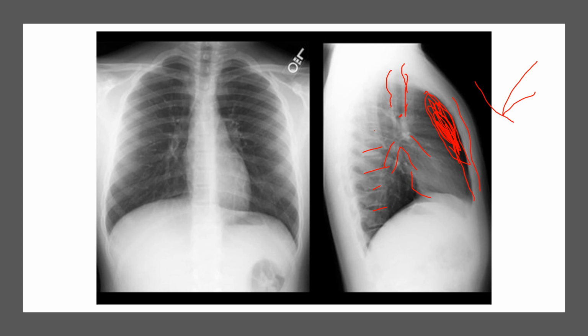Usually you won't see the pneumothorax on an x-ray if they have a tiny pneumothorax on the AP. Usually you'll see it on the lateral x-ray. And then for COPD and emphysema, the bigger the stages, the more air trapping there is, the larger the retrosternal airspace is. And so that's something that we'll pay attention to. So laterals can be pretty valuable for a number of different reasons, but I don't want to go into that too in depth with you.